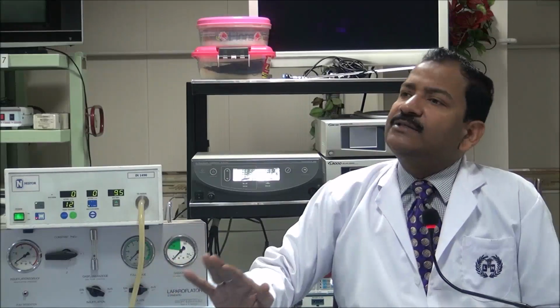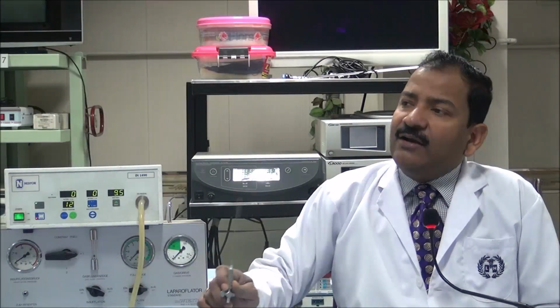Now how much is used during 1 hour of the surgery? During 1 hour of the surgery, the minimum is 18 liters of gas. That means you are a good surgeon. In 1 hour of surgery, if you have used up to 18 liters, that means it was okay, it is tolerable. But at the end of 1 hour, if you have used 50 liters, if you have used 100 liters, that means you are not a good surgeon.